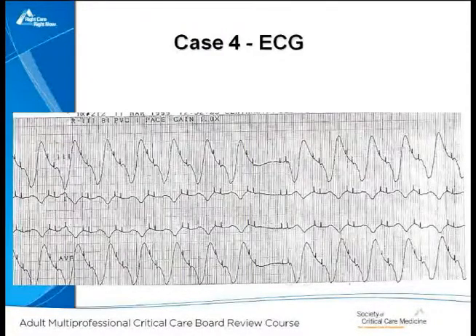You then go out here and you really can't see atrial activity, so I can't really comment much about it. But out here we see that we have an atrial spike and a ventricular pacing spike, and loss of capture. And then we go back to the previous pattern. And so what we have here is a very wide QRS complex and loss of capture.